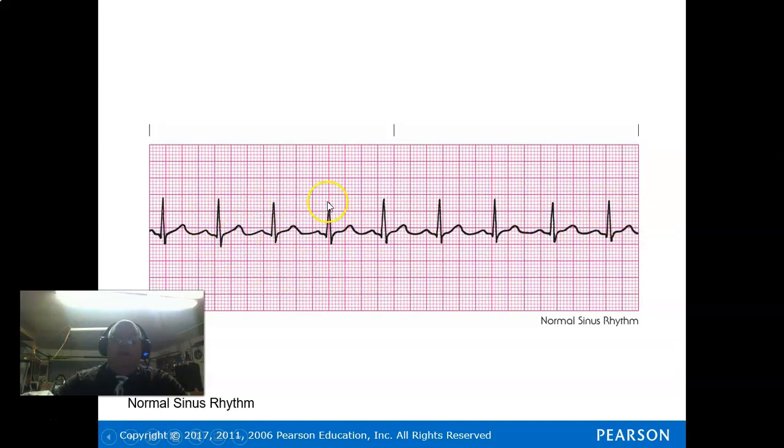Again, if I do it the box method, 300, 150, 100. It's just a little bit less than 100. So there we go. Then again, it's between 75 and 100, probably more towards the 90. Look at that. It just happens to match up.